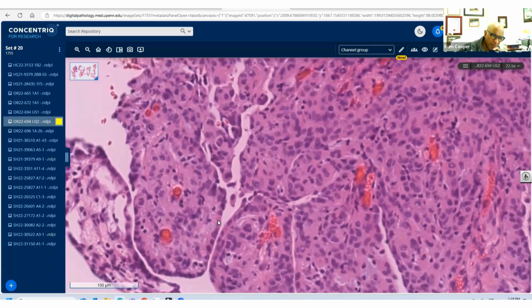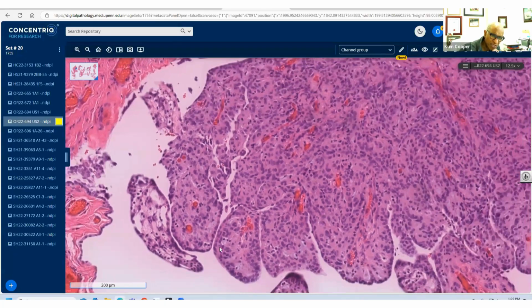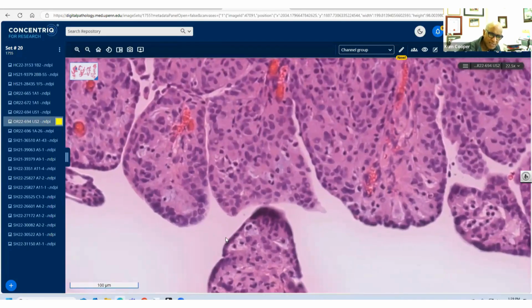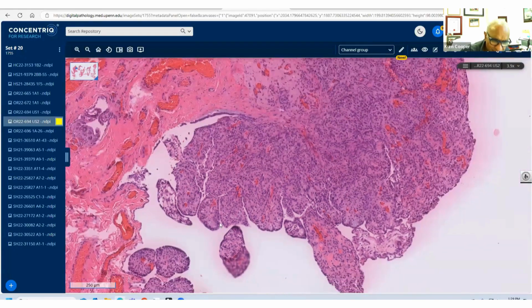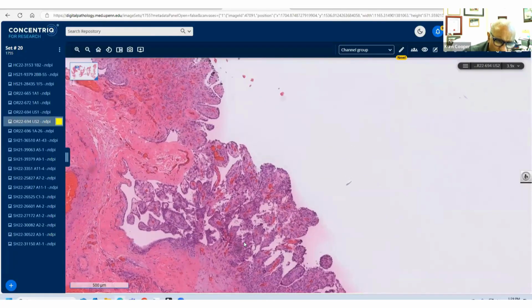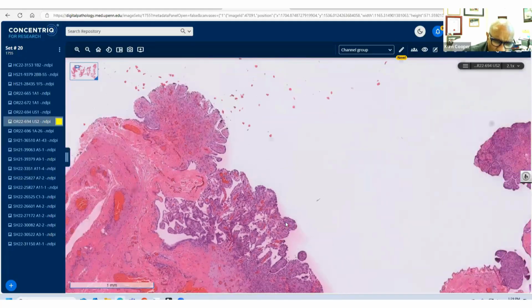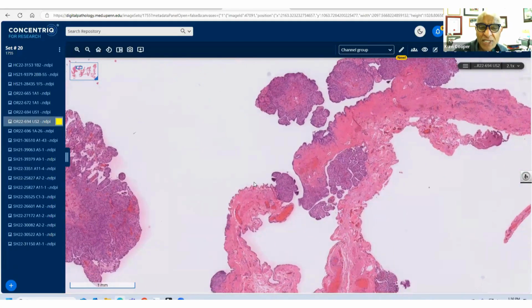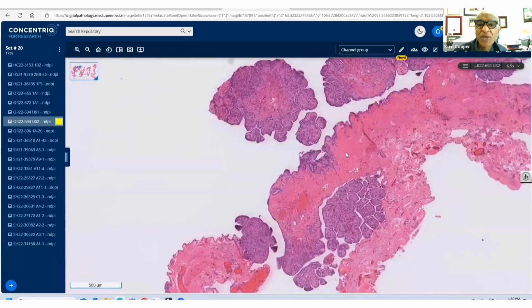But BAP1 works very well in our hands and was lost in this as well, Carla. So BAP1 is useful, which told us this is mesothelial, this is a mesothelial neoplasm. The question is, what do we call it, right? Because we had these papillary excrescences, so we can make up papillary mesothelioma, but well, you know, how do we go from there? And there's one other feature I want to show you just to help.